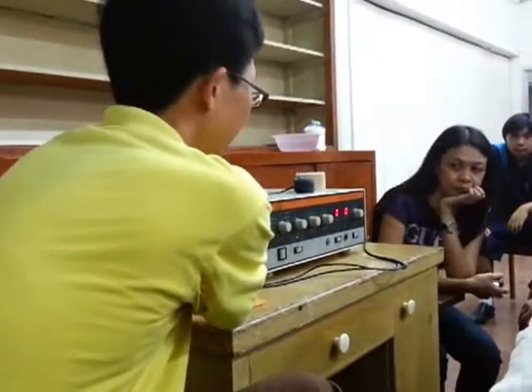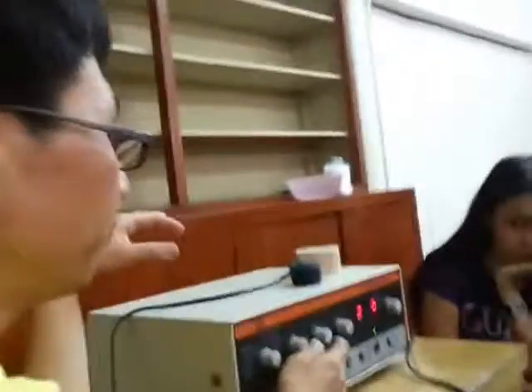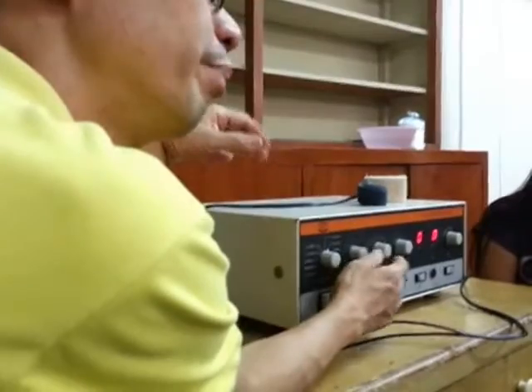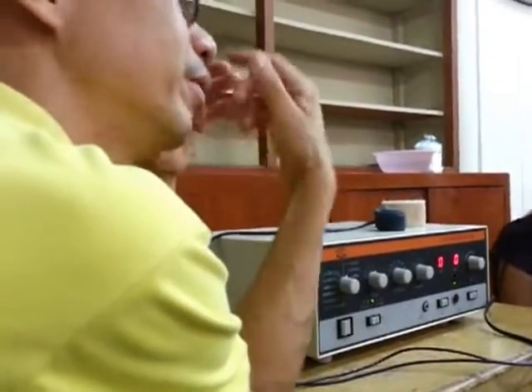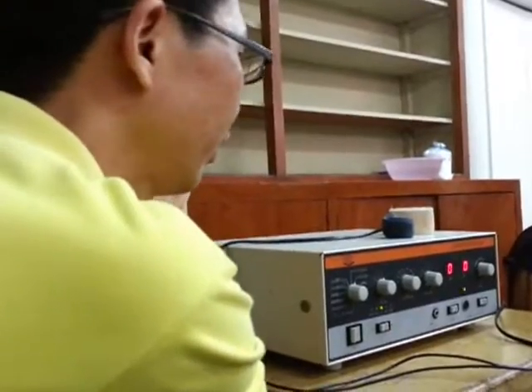If the muscle is denervated, meaning no nerve, usually we're going to use the longer pulse duration. So it would extend from about 100, 200, 300.